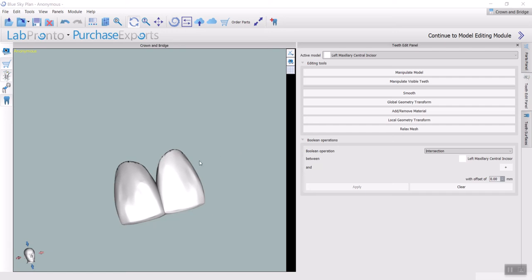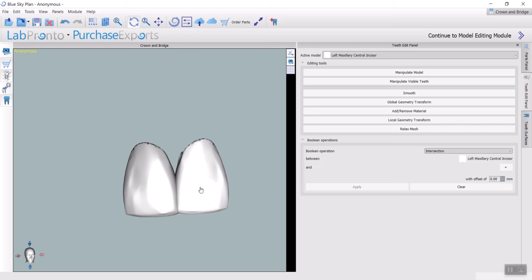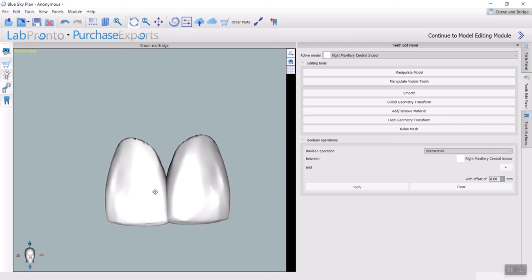And sorry, I just forgot to mention the Boolean intersection, which is one that I hardly use, but I'm pretty sure that there will be functions for it later on. So let's say that I want to get the anatomy between two objects, or the geometry between two objects.